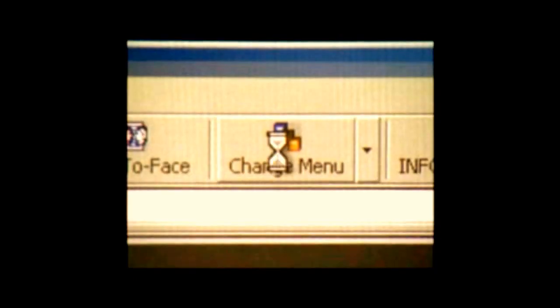In the diagnostic mask, you can read all the data of the selected diseases, including the histopathological features of differential diagnosis, and have a look at the corresponding pictures. Changing menu, you may gain access to the green one. The green menu allows the user to make changes to the database. You can add or delete diseases, add or delete histopathological patterns and sub-patterns, add new histological criteria, and store new pictures in your personal database.